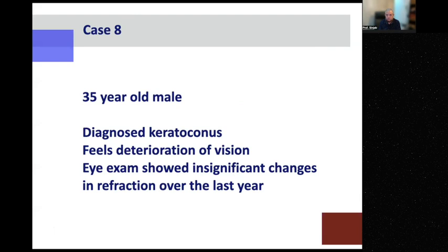No questions. Why do you depend on Kmax of the front map, not the third box? No, I don't depend on Kmax at all. There is no Kmax of the front map.